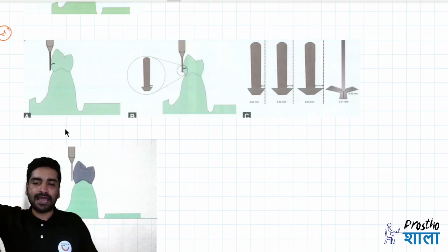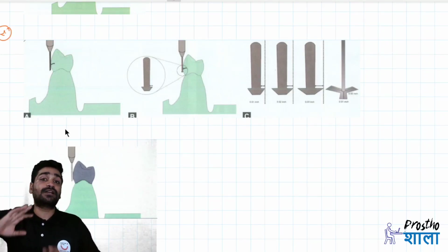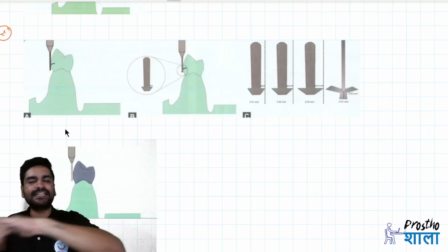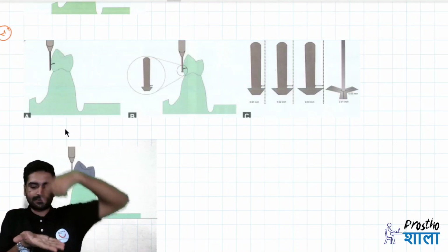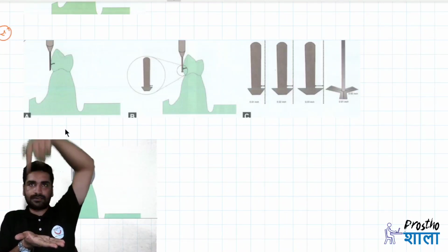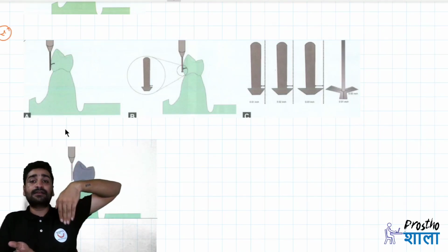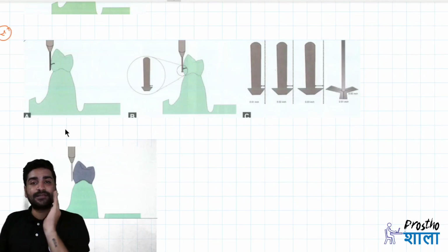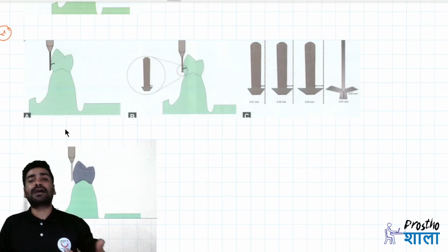And same as you analyze the contours, again you analyze the contours, but the change will be that the markings will be produced on the most prominent part of the teeth. So when you keep the cast, the arm is always parallel, right? When you run across all the teeth, whichever area is most prominent, that area will be marked automatically. So what you are marking?